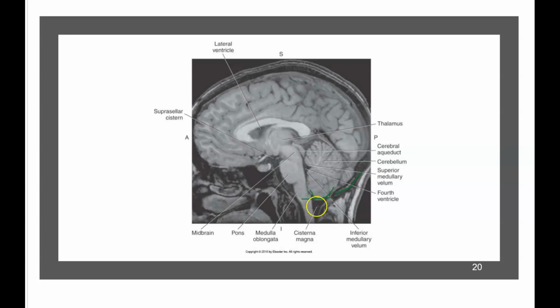So this is a cisterna magna. It fills in this whole section down here. It's pretty crazy. All right, here's your medulla oblongata. Here is your pons and your midbrain. So midbrain, pons, and your medulla oblongata, and that goes down into your spinal cord, okay?